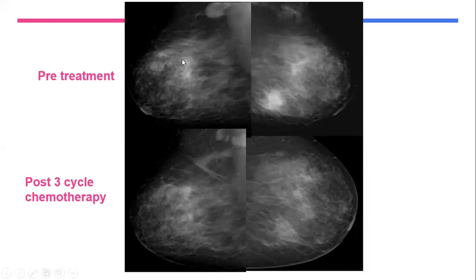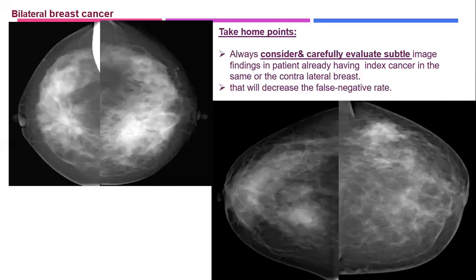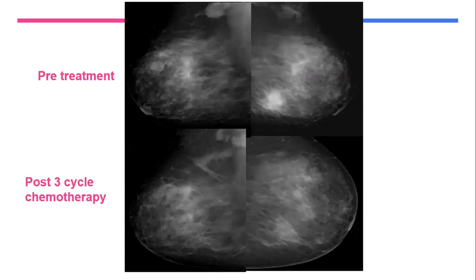You see, even there are some asymmetries, multiple asymmetries, and the one adjacent to the cyst regressed on the follow-up. But I suspect this asymmetry, like in the contralateral breast, there are also a lot of asymmetries not proven to be suspicious for multifocal disease. That is why I suspect it is the same background fibrocystic changes. Okay, if you look here, what raised your suspicion previously that this was a malignant finding? The regression of the cyst size and the lymph node?